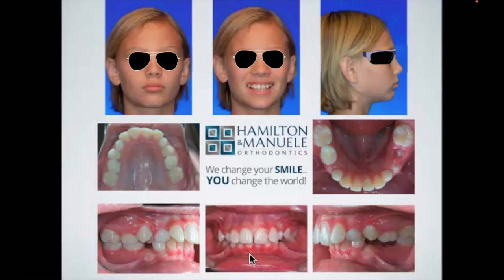Does that tell us really anything else besides what we already knew about the retroclined mandible and the overjet? It's kind of just another way to say it, right? Okay, that's fine. Let's move away from the AP. Let's look at some other facets of this case.